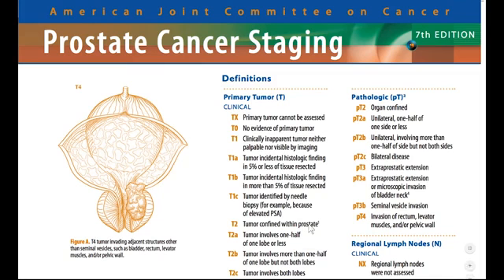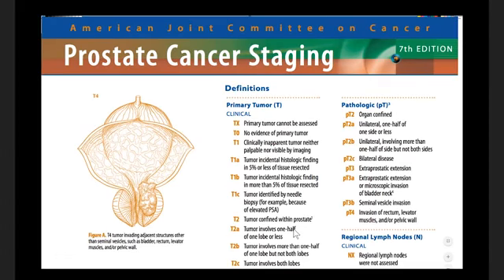Right now, I'd like to focus on the T2 capsular confinement. So when is a tumor confined on imaging within the capsule? One, when the capsule, which is this peripheral area right here, it's the outer edge, also known as the anatomic capsule. There'll also be a pseudocapsule, which defines the margin between the central area of the prostate, known as the TZ. The anatomic capsule, true capsule on the outside, the surgical capsule, a pseudocapsule on the inside.